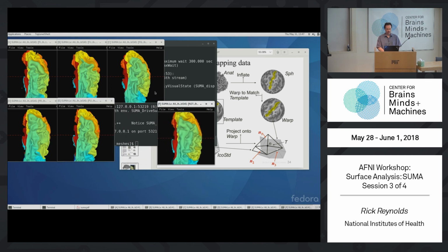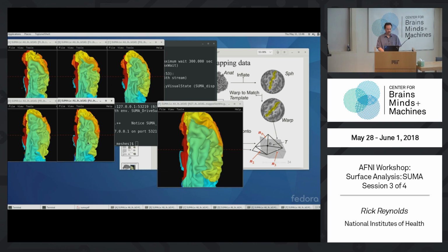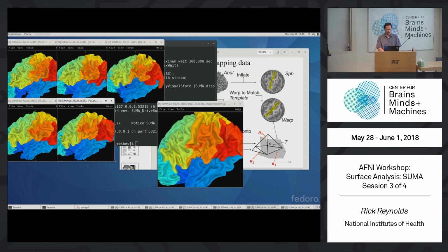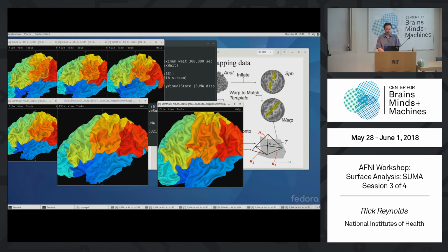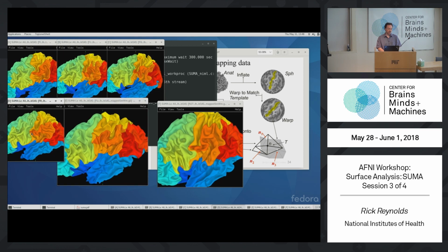So this is actually 6 different subjects, and they're all locked together. The colorization, like Daniel said, is based on the node index. But for example, if I go right in here, you see where this darker orange area protrudes into the tannish orange area, whatever. You can see it's a slightly different shape than it is in this subject and in this subject. That gives you some idea of anatomical variability after the registration.